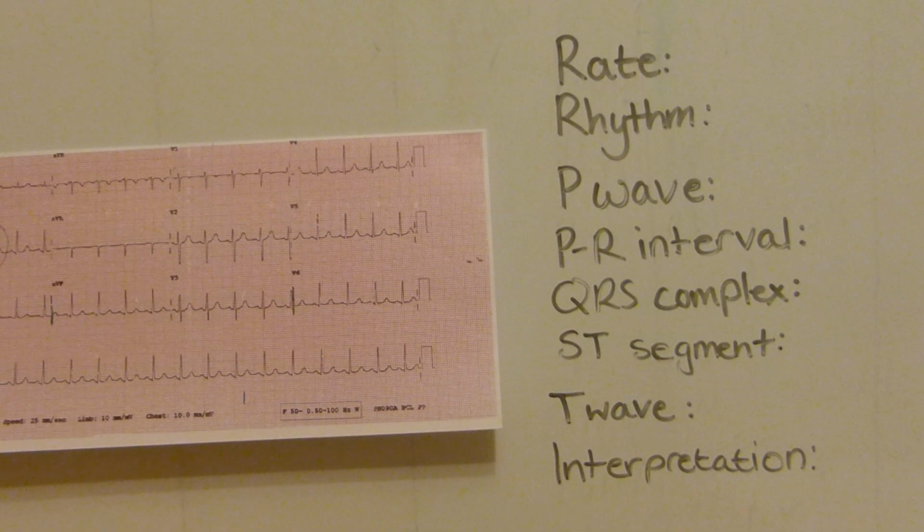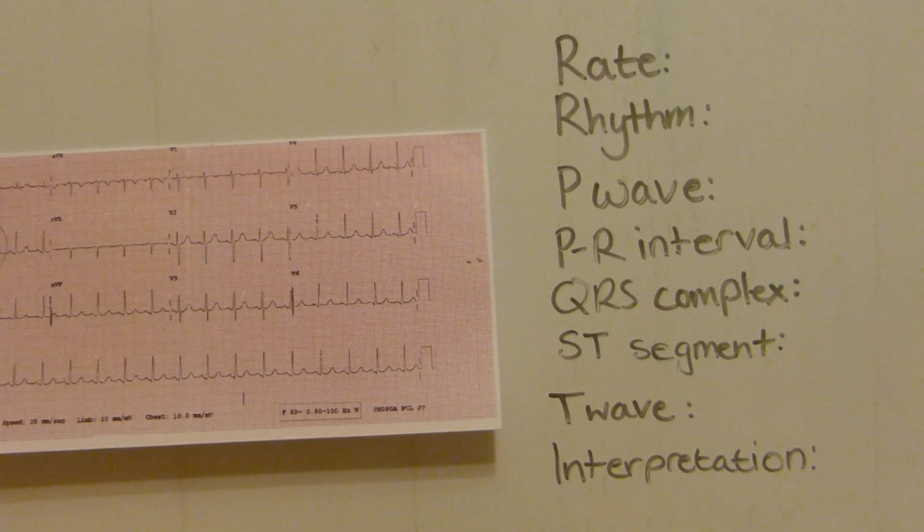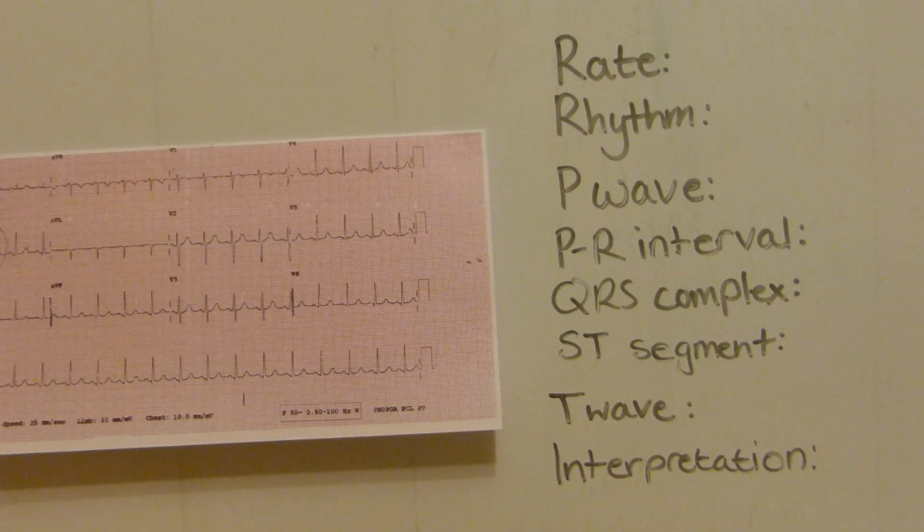Now I'm going to demonstrate an interpretation of an ECG using a systematic approach, and this helped me learn to interpret ECGs, as it can be a difficult skill. So to start off with, you work out the rate of the ECG.